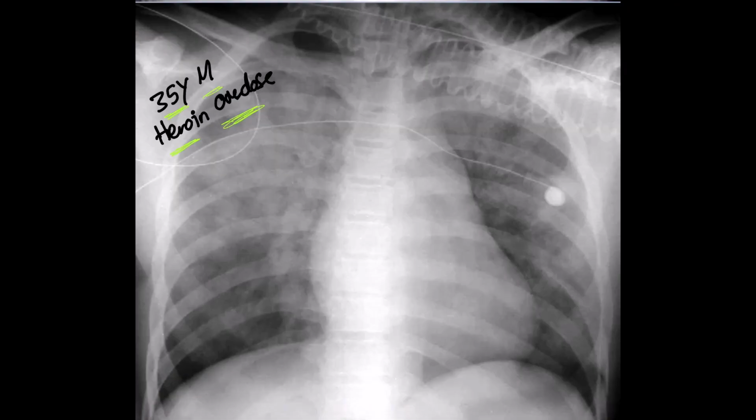So you can see here, this is an atypical distribution of acute pulmonary edema, and it's more apical rather than perihilar, so it's here. Usually the acute pulmonary edema has a bat wing appearance and arises from here. But in the clinical scenario here, it goes more with an acute pulmonary edema, and its appearance is more of an acute pulmonary edema rather than aspiration.